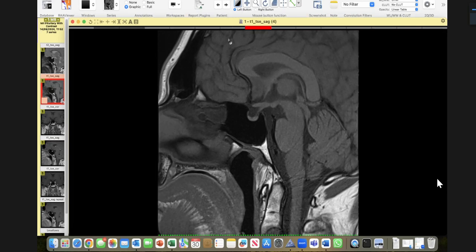But you could have been more elaborative there on post contrast, talking through the scan, your thought process. Thought process is that you are ruling out a microadenoma, and then in conclusion, you say that the only thing which I have picked up is that the posterior pituitary bright spot is non-visualized, and this is in keeping with idiopathic diabetes insipidus.